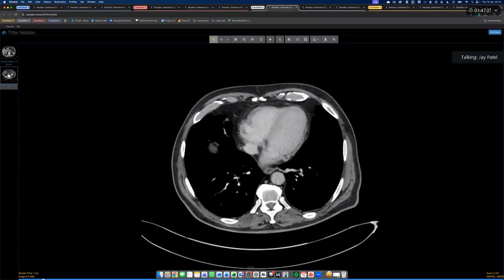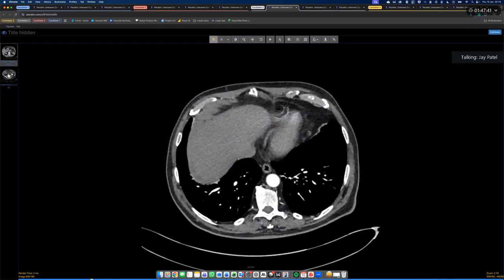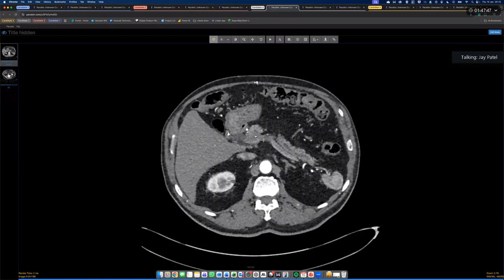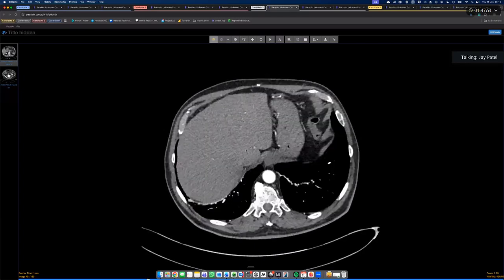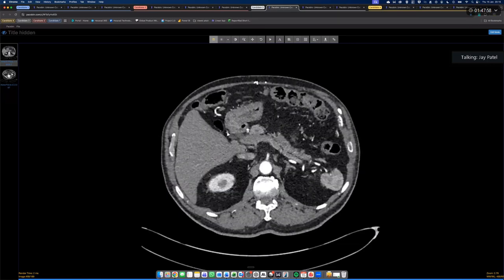So the arterial phase wasn't particularly telling, other than to say that you could just about see that the duct was up here, and the duct wasn't really up in the rest of the pancreas. To my point earlier, this is a vascular phase or an angiographic phase, as you described this arterial study.